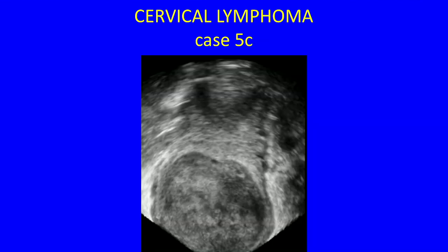And on 3D, again, you can see how reasonably regular the outline is of this kind of cervical tumour compared to a squamous cell or an adeno. They look very much more ragged and invading than the lymphoma does. But lymphoma is quite rare in a cervix.